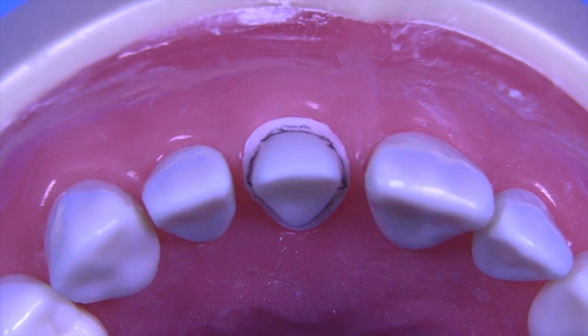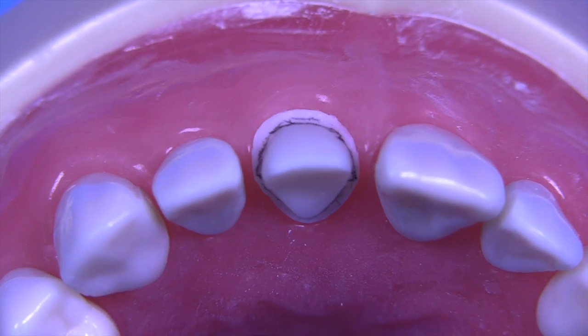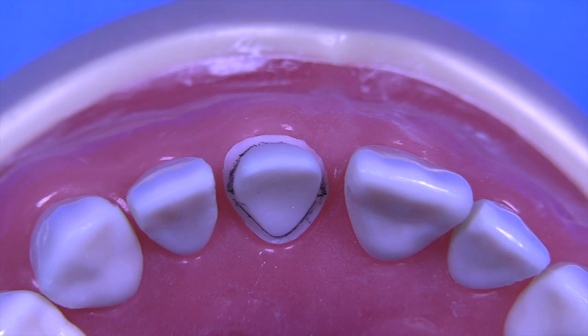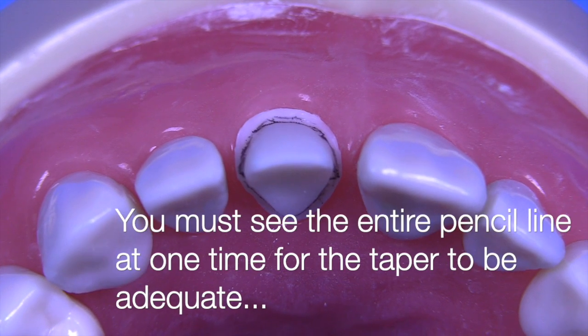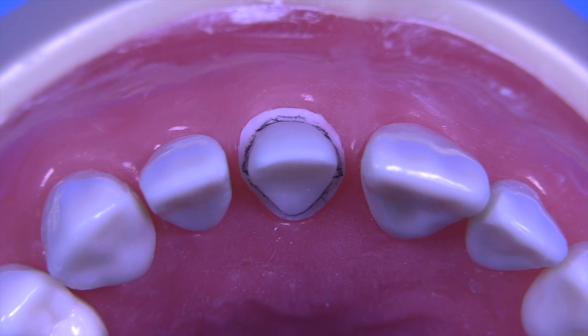You can see here that the draw is very, very tight. In fact, I would say undercut. So when you look at the lingual side, it has draw, but the facial doesn't. And then if we tip it this way, we see that the facial has draw, but the lingual doesn't. So somewhere in that preparation on the facial and lingual area, you have an undercut.